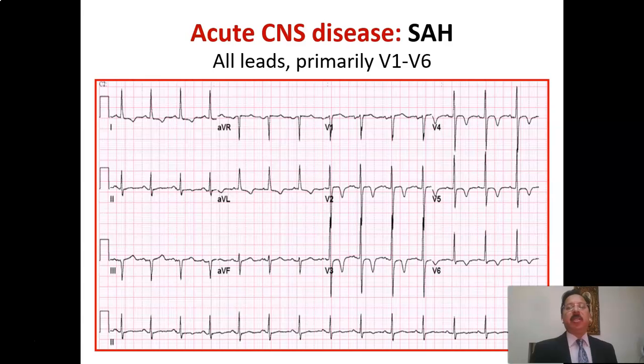Look at this patient. This patient was brought to the emergency department in an unconscious state, and ECG was recorded. And look at the deep T wave inversion in V2, V3, V4, and V6. This patient actually is a known case, diagnosed as subarachnoid hemorrhage. So central nervous diseases can also produce the ST segment changes.